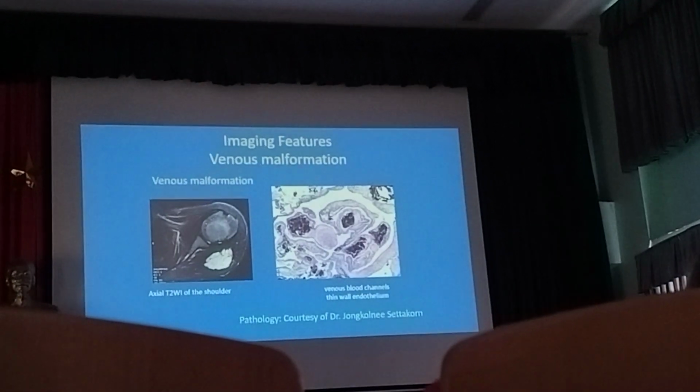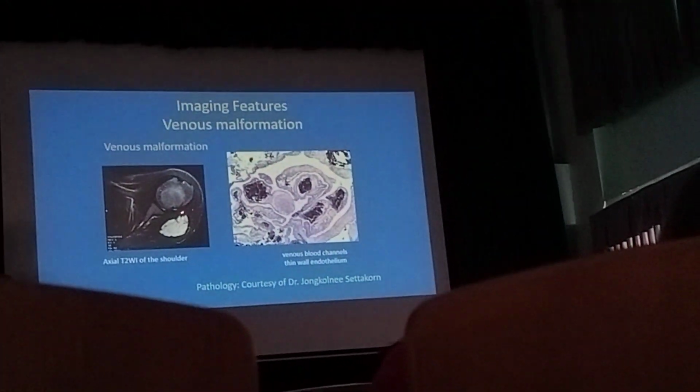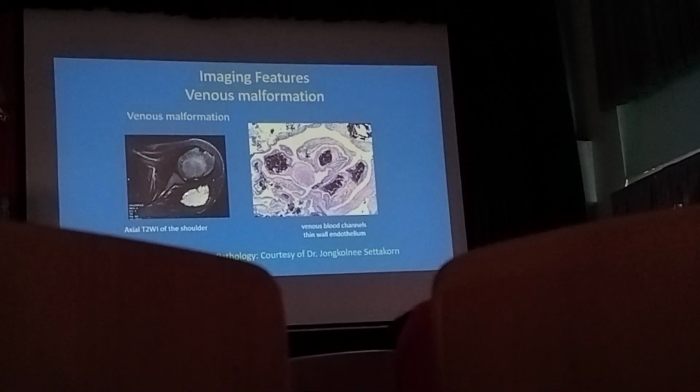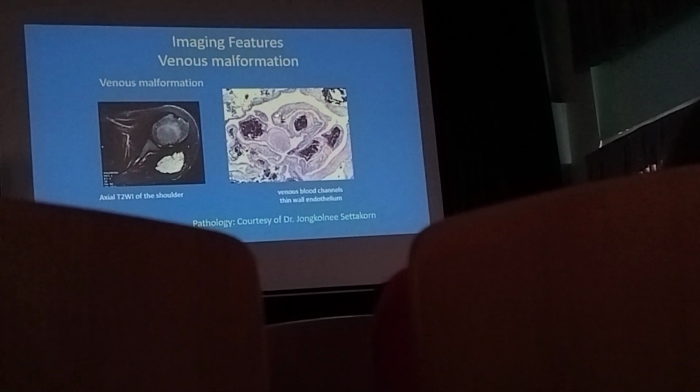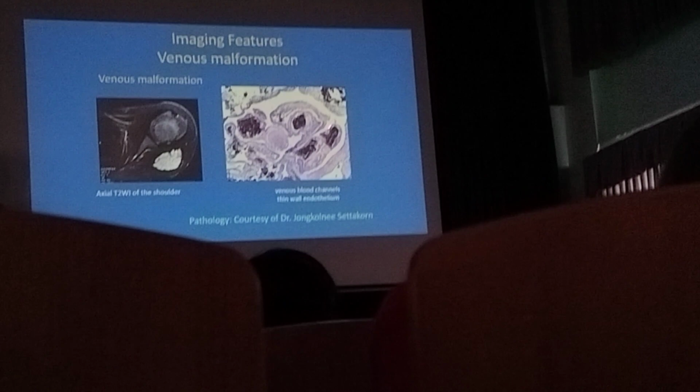Most of the case will be venous malformation, which you have the bright signal of lesion around here. It's like a channel of fluid. So this is the fluid, that's the wall of lesion and has blood inside.